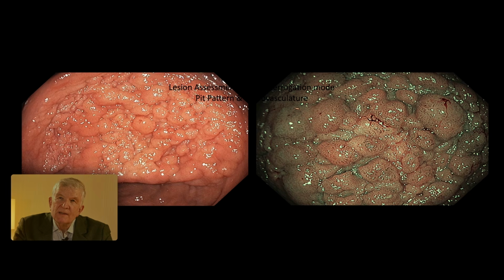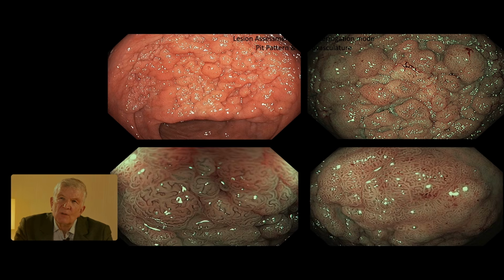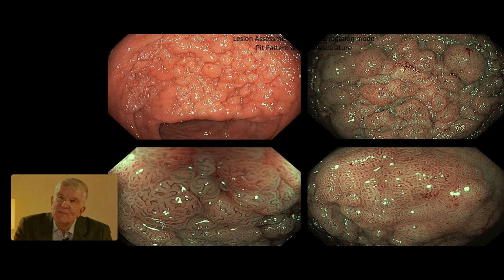So important is there are nodules all over the place. They are of similar appearance. None really stands out by size. And there's this granular, non-granular. So this is granular. This is granular. We have some non-granular examples. Everybody would agree this is granular. Okay, let's look at some others.